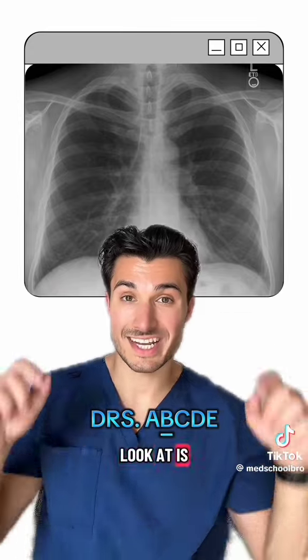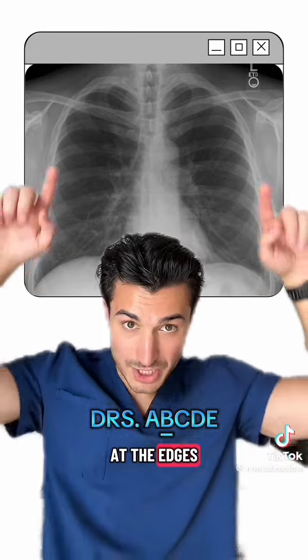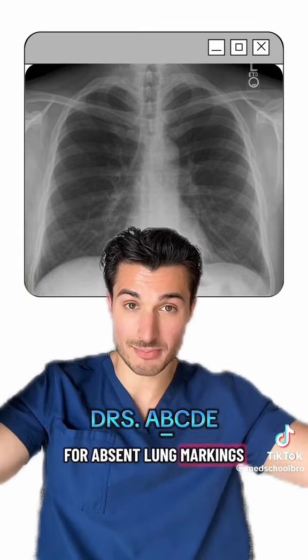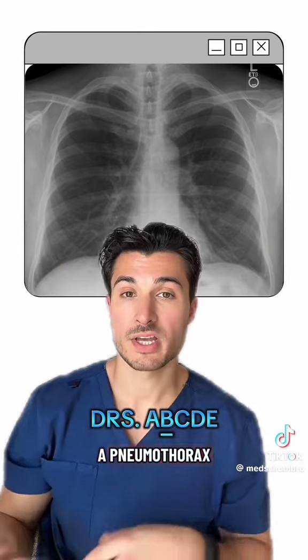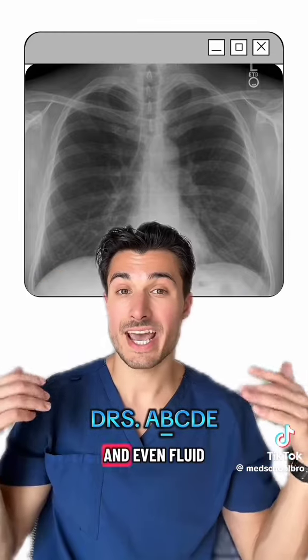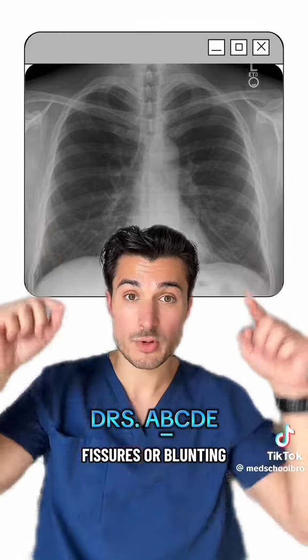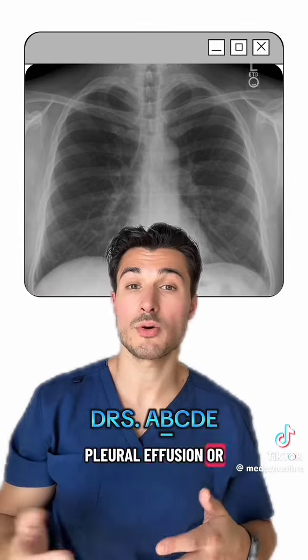Next is B for breathing, the lungs. First thing I want you to look at is these lung markings, these vascular projections. In particular, look at the edges of the lungs for absent lung markings, where it's just black. This may indicate a pneumothorax. The other things I want you to look for is infiltrates or consolidation, and even fluid overload in the fissures or blunting of the costophrenic angles, which may indicate pleural effusion or pulmonary edema.